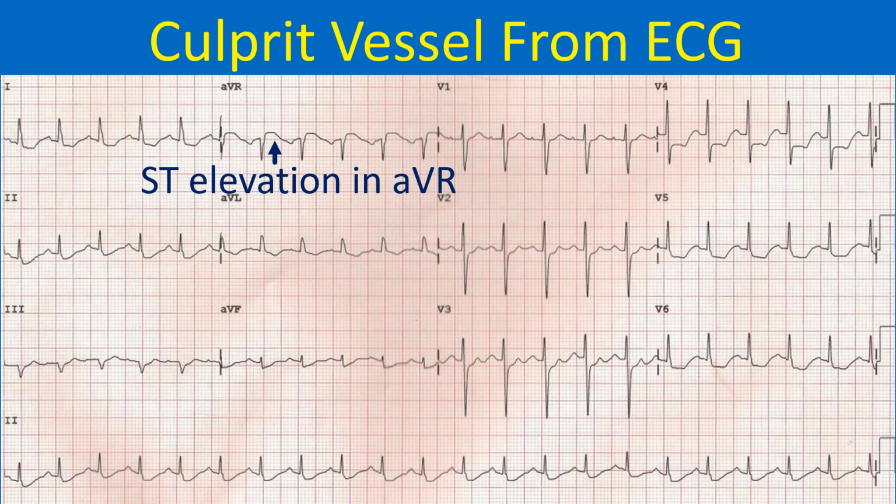This is another ECG from a person with persistent anginal pain for the past several hours, showing significant ST segment depression in anterolateral leads along with sinus tachycardia. ST segment elevation is noted in AVR. Such a pattern is consistent with significant left main coronary artery stenosis.